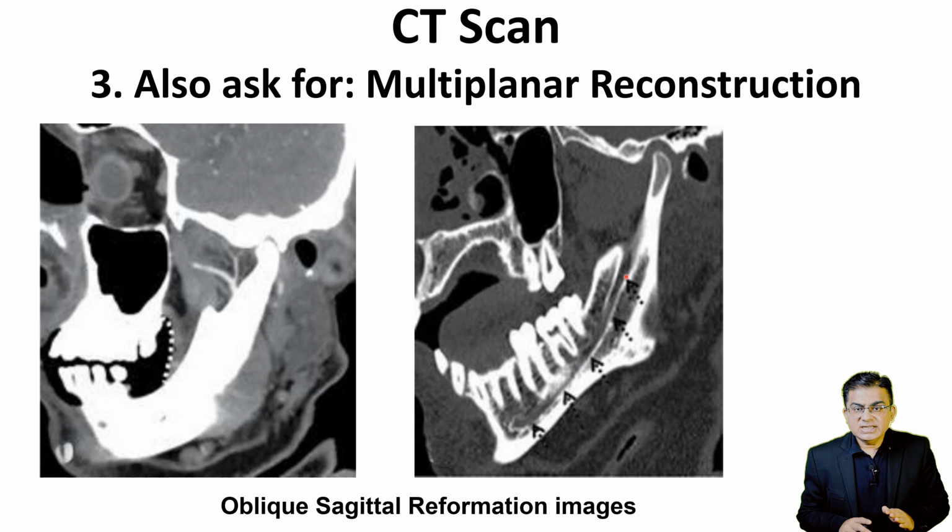If you had not done this multiplanar reconstruction and looked only in standard axial, sagittal and coronal views, you would not have seen the entire inferior alveolar canal so beautifully, and you might miss early inferior alveolar nerve involvement. Remember, it is an important anatomical pathway for perineural spread of cancer on the floor of the mouth.